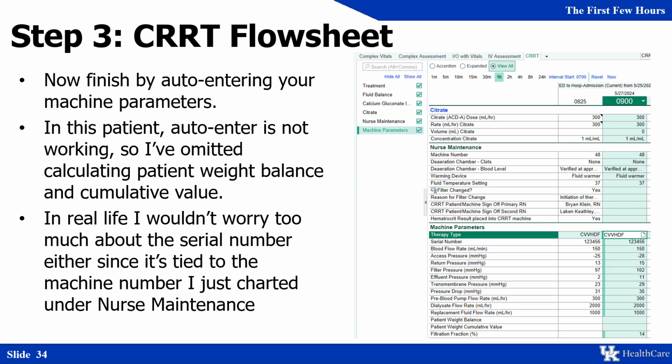In this particular example, I was using the playground, so I don't actually have the patient weight balance or cumulative value to enter, and that's okay. If you don't have auto-enter, just don't worry about those.